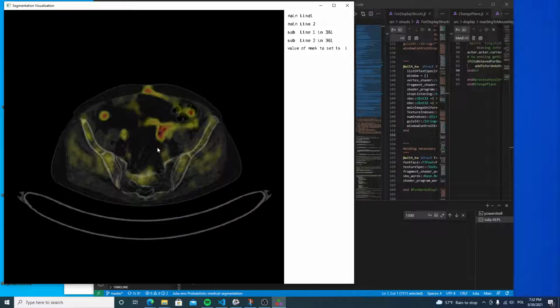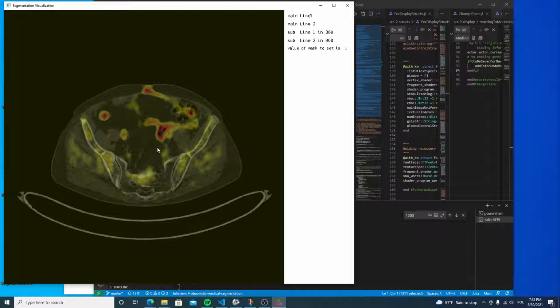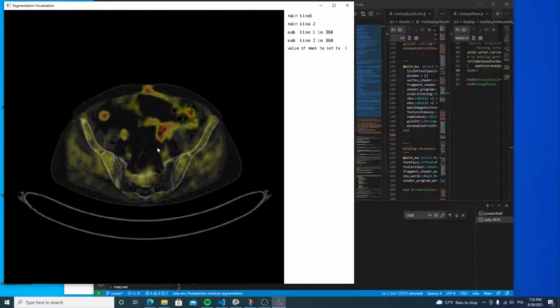So for example, when I press F5 and plus, I increase the range. We can see that values are less and less pronounced. Whenever I press F5 and minus, I decrease the range, because F5 is controlling the upper bound, hence it would be more pronounced. When I press F4 and plus, everything will be more pronounced, and after some time, of course, we'll see pathologically that everything becomes visible because everything is trimmed to this smaller range of values.